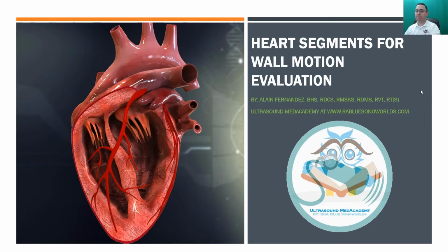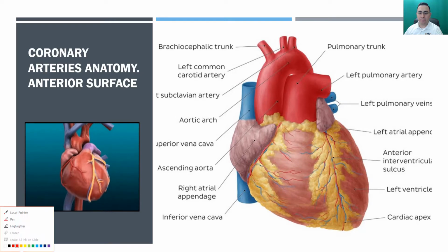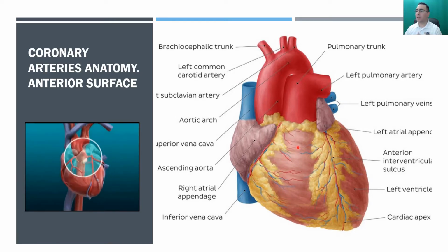Okay, moving forward, let's take a look at this picture here. All right, so look at this.